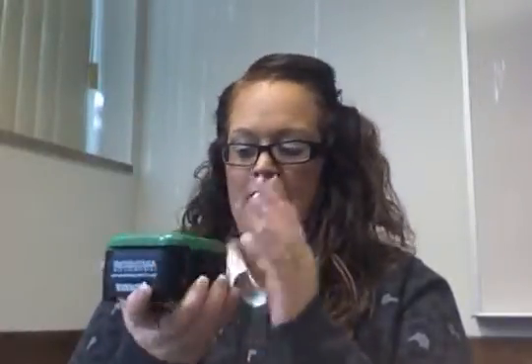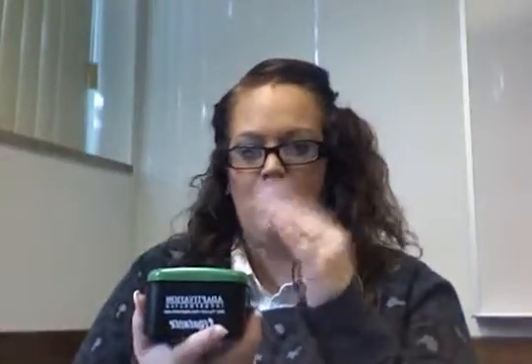This sequencer I actually really like because it's super simple, and anyone, the mom, dad, anyone can just record simple little phrases for them, and it doesn't take much for the child just to hit the top button. They don't need to be fiddling with things. They just hit the button and it is their voice for them.